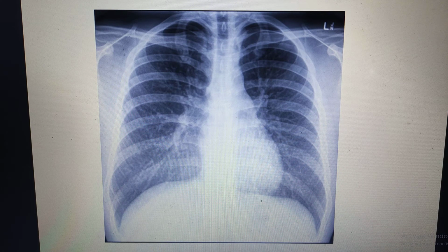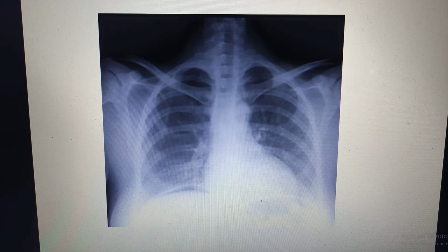That is a medical emergency, rather I'll say it's a surgical emergency. So, what is the gas under diaphragm? What does it mean? Before we start, I'll just give you this X-ray, that is the meaning of gas under diaphragm. But before that, you have to understand the basic understanding of the chest X-ray.